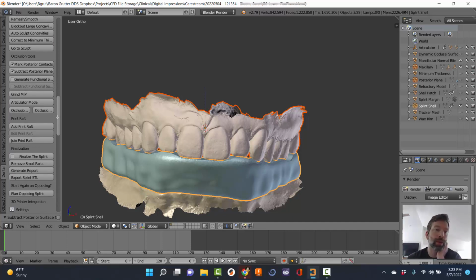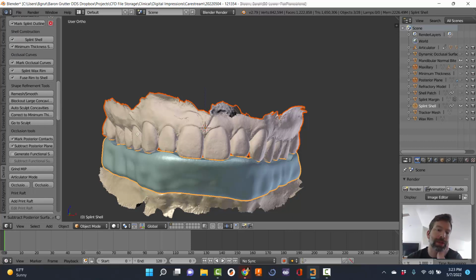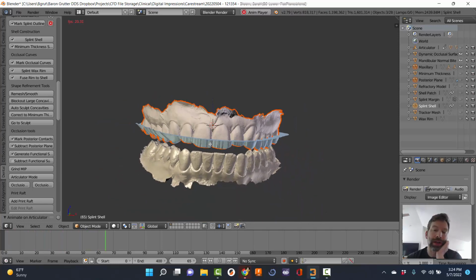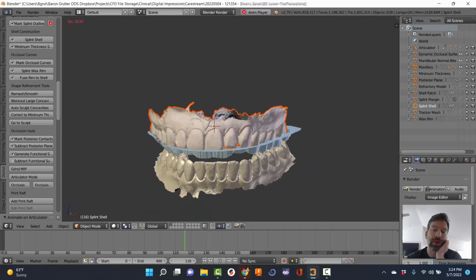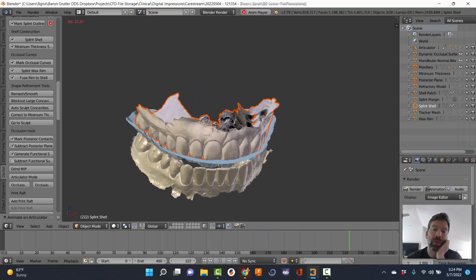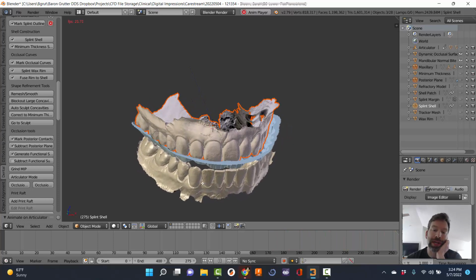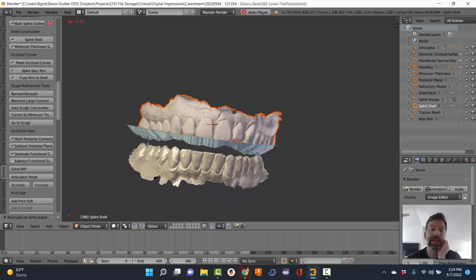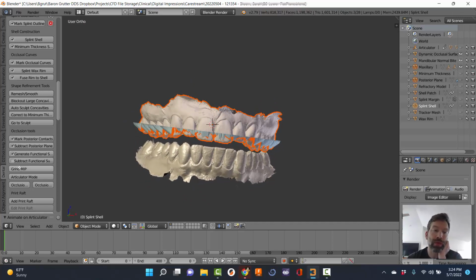There's like 3 different major steps, and there might be the Splint Shell. I can't remember. There's 3 different things that happen in the background that save you time, but this is the biggest time-saving one, because watch what happens. I'll tell you what's happening. So the software is, imagine it's on that articulator, and it's moving the jaw in all the different functional ways, and it's recording them. And it's creating that tent pole idea of where the teeth would move as the jaw is moving around.